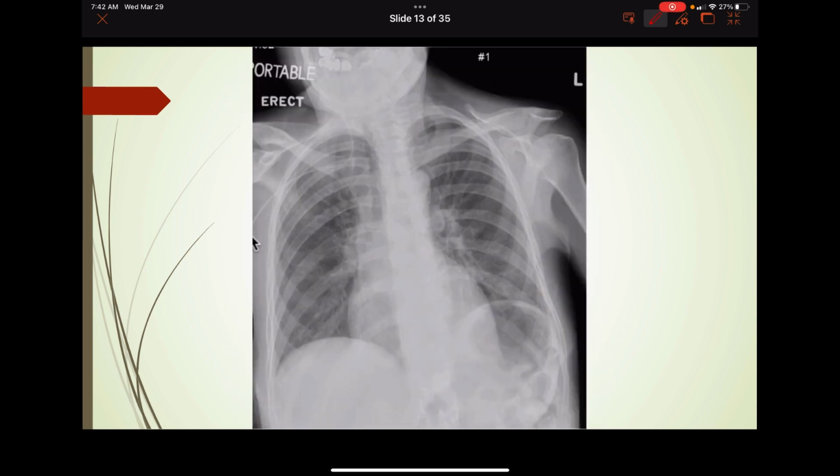And another one, A for airway. Here's the trachea coming down. Kind of difficult to see again. So let's count. Looks like first rib, second rib, third, fourth, fifth, sixth, seventh. Did I count that right? He's kind of twisted, so it makes it a little more difficult.